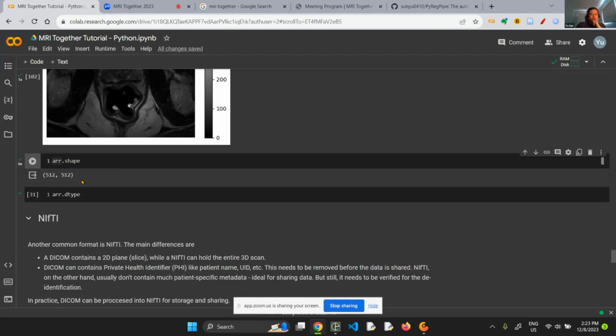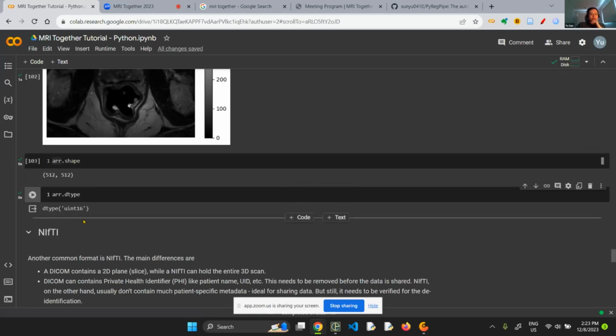All this knowledge will help at this point. Here I just show you some simple things, like how to get the shape and the data type. But with NumPy, there are much more complicated things you can do to manipulate the data.